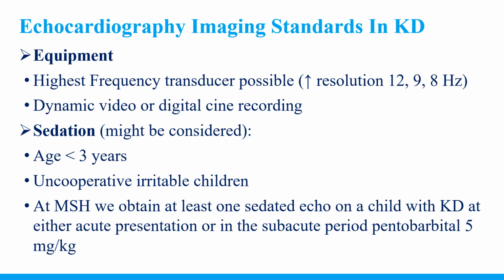When imaging children with Kawasaki disease, you will need the highest frequency transducer possible, because you're looking for higher spatial resolution. You want to make sure you acquire movies and not still images. You might need to sedate children that are younger than 3 years of age and those that are uncooperative.